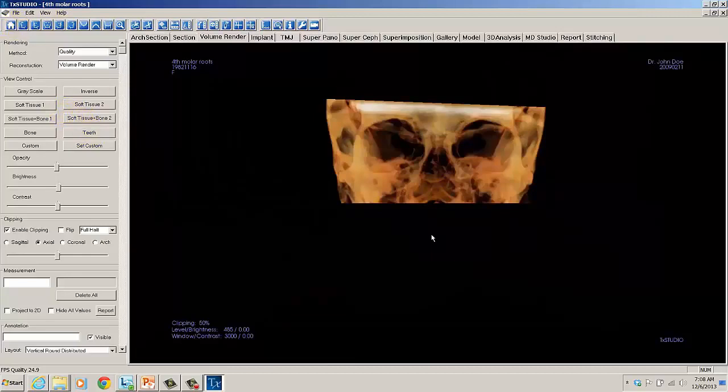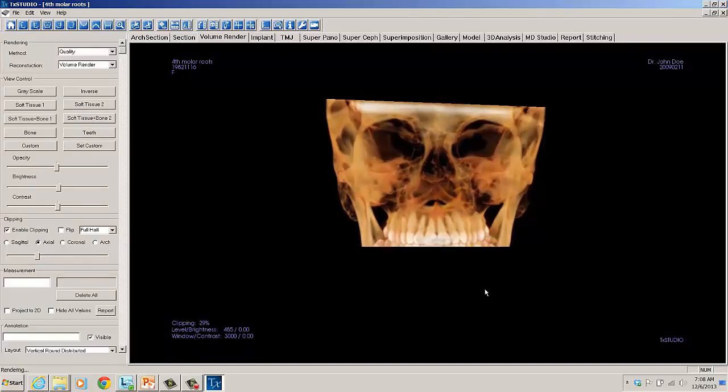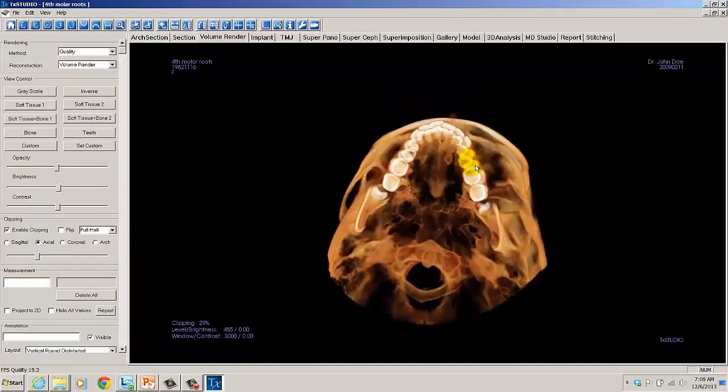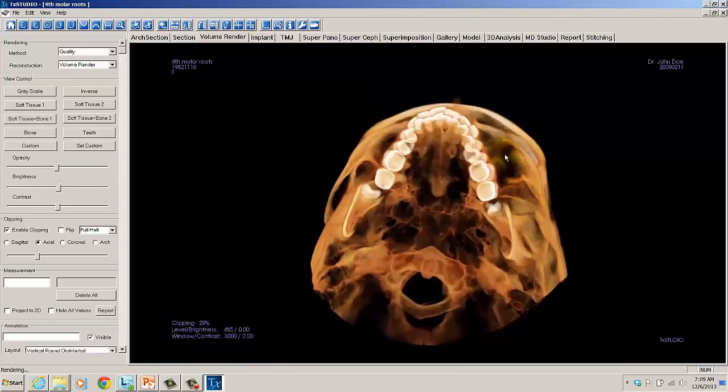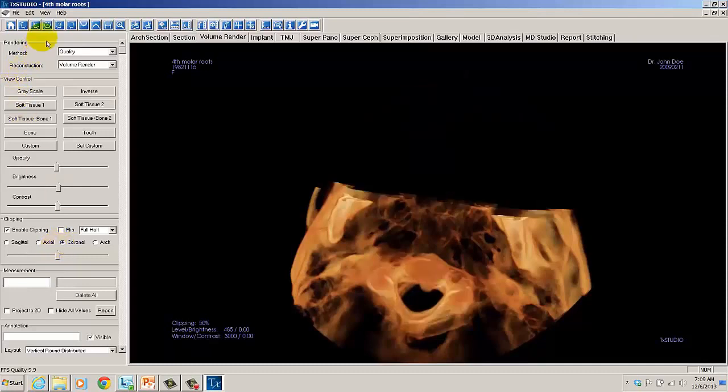And it would remove from top down material, and we can go ahead and look at the view of the patient. Let's go ahead and enlarge the patient, and we can see what happens as we replace information that has been removed or adding it. We also have coronal clipping.